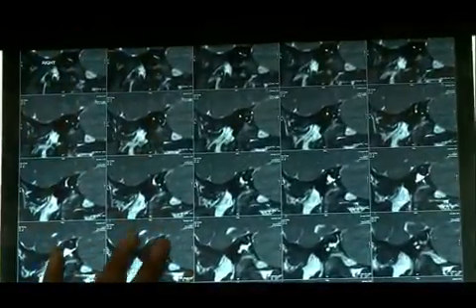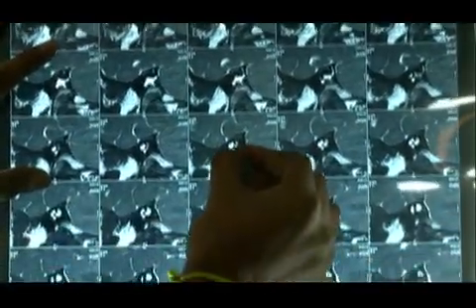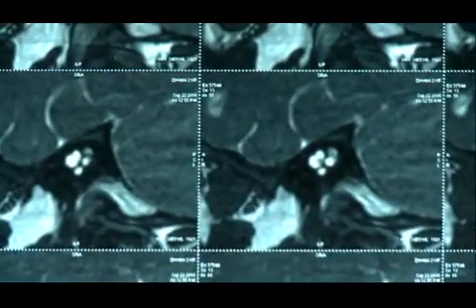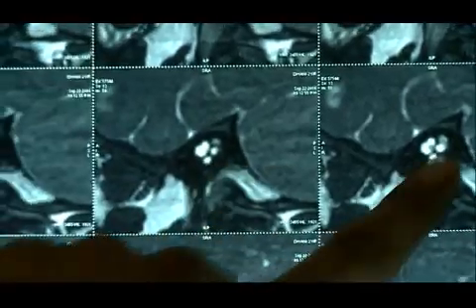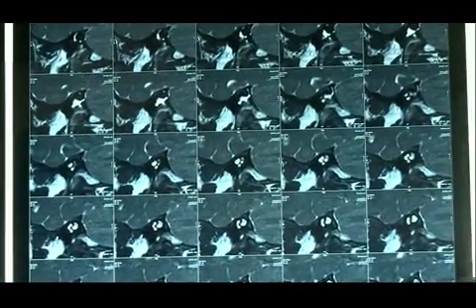So on sagittal section, what you see is the internal auditory meatus coming from medial to lateral on both sides. In the sagittal section, you get a cut section of the internal auditory meatus with all four nerves in place. Can you see? Yes. This is what you need to see on sagittal section. That gives the best picture of the internal auditory meatus and the architecture of the nerves. Can you see? Yes, we can. This is so clear. All the four nerves with good dimensions and the intra-auditory meatus with good dimensions.